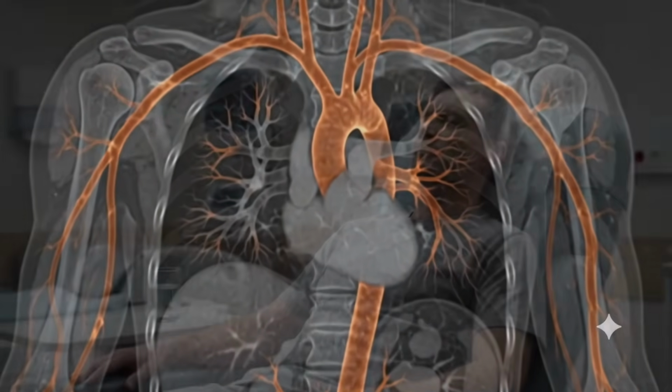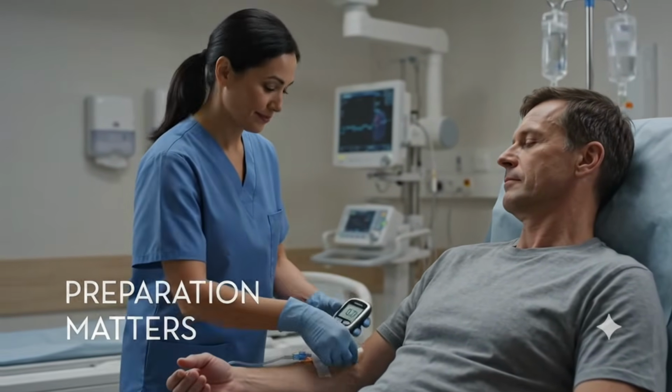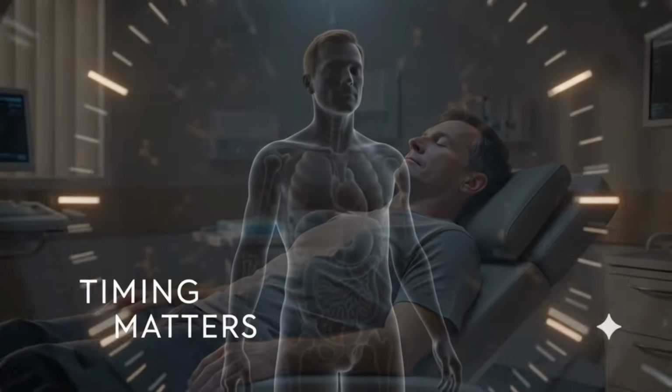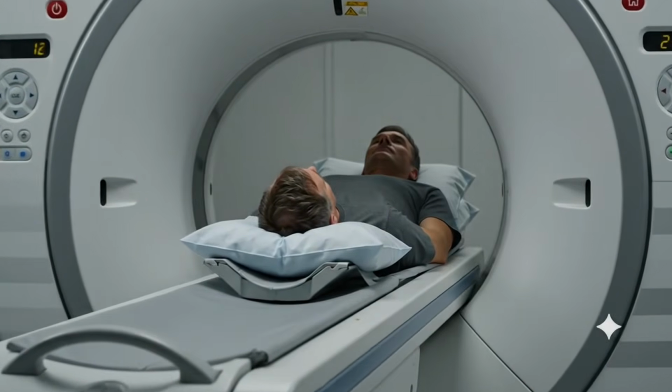Before the tracer reveals inflammation, preparation matters. Fasting, hydration, and controlled conditions help reduce physiological uptake and improve image quality. Timing matters too. After injection, a standardized uptake period allows the tracer to distribute before imaging, improving consistency and helping us interpret.